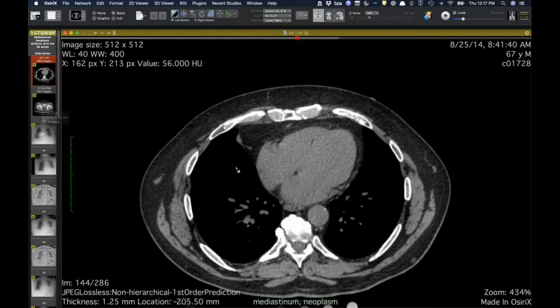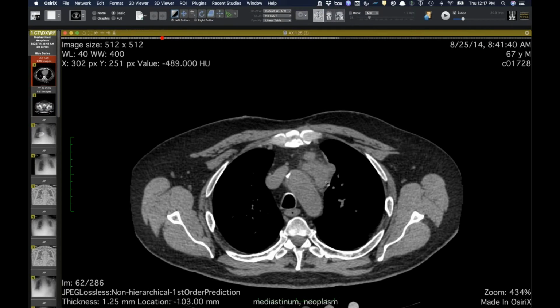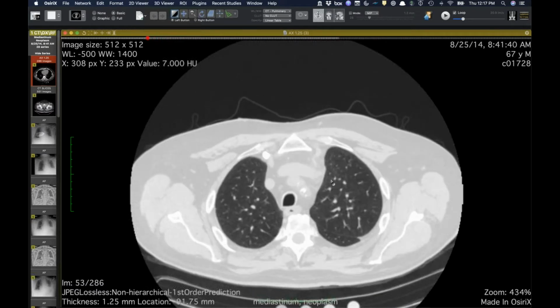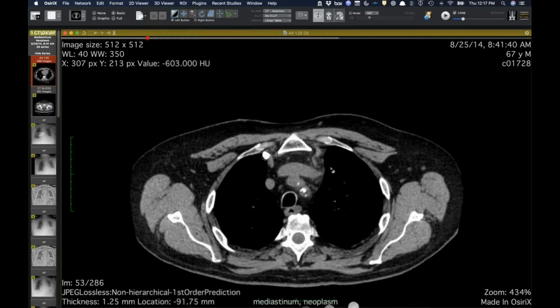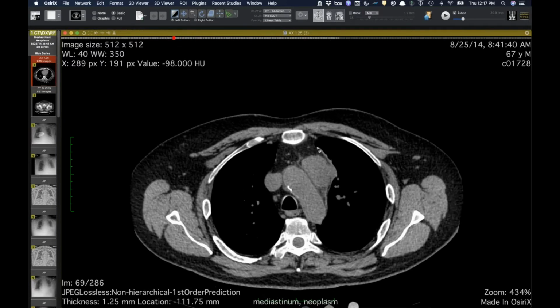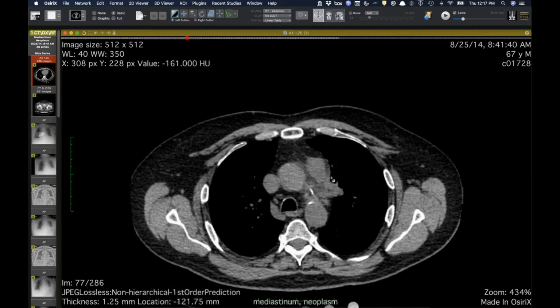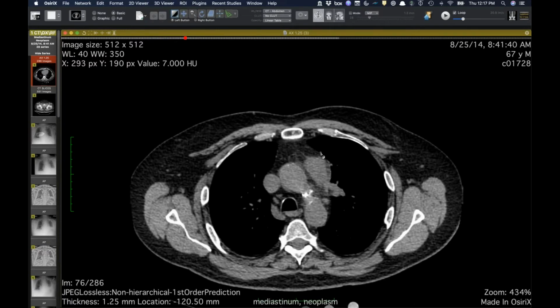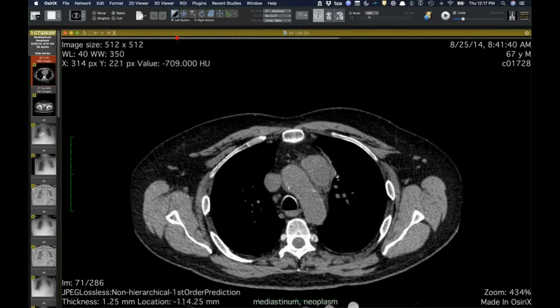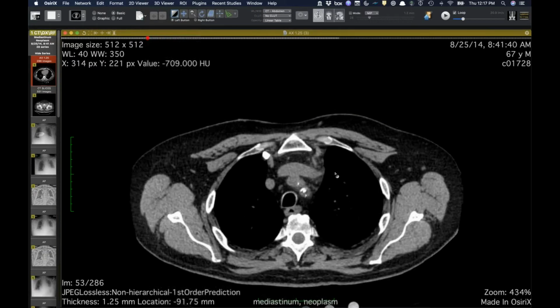Before you go on, can you just go back up there, Travis, one second? Is the mediastinal pleura around it thick? Yeah, there's something wrong, I don't like that. Good question. Is it a little atelectatic lung, or is there focal pleural thickening, or is it pleural tumor? Some of this is atelectasis. The rest of it, I don't know. You're exactly right, there are subtle findings there. What was that making you think about? I'm just thinking of a pleural membrane tumor extension in a case like this.